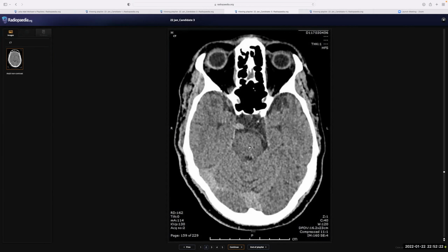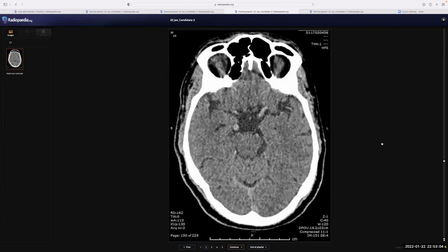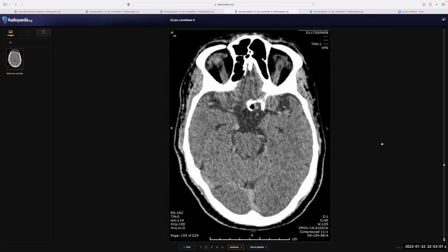Because the patient is drowsy, I will convey my findings to the referring clinician, because they may need thrombolysis or thrombectomy. There is a possibility of worsening the situation of the patient. It is risky; he may progress to coma because of this thrombosis in the tip of the basilar artery. I haven't seen any other emergent finding, but this is really an emergency. So I will inform either the referring clinician or interventional radiology to do the possible things regarding thrombolysis.